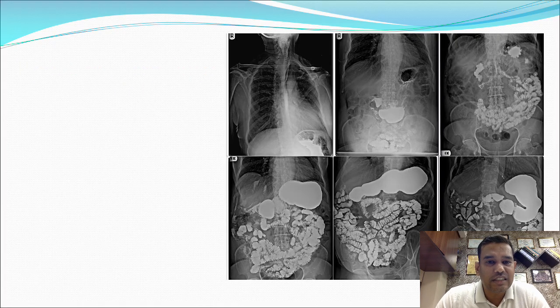So what is this X-ray? Is this a single X-ray? No, this is not single. First of all, it's a contrast X-ray. You could see the radio-opaque shadows denser than the bone. So this is a contrast X-ray, or you can call it a serial X-ray taken over time.